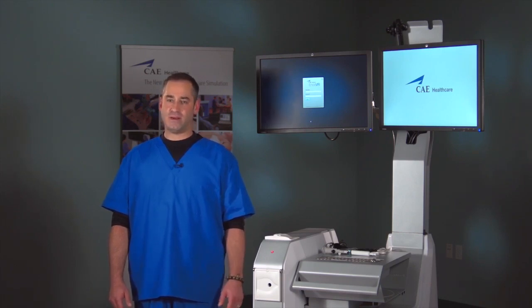All of these should be considered as there are different procedures and modules contained within the system that will be of interest to them. Next, I'm going to discuss a little bit more around FES and SAGES. This may be new nomenclature to you, but it's very important, as when you try to position this system to the general surgeons in particular, you may get some feedback and some objections that you need to be aware of.